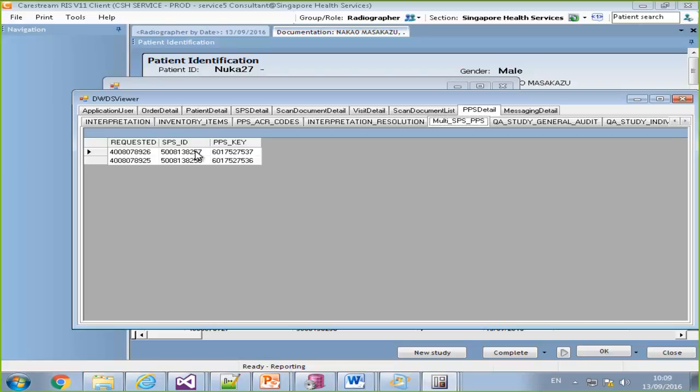I thought you could document together, you just have that particular field would not be copied. If you want to keep copies, you can, but then you won't enter the two fields individually. One procedure would have a certain radiation dose, and the other procedure would have a different radiation dose. But on the data window, you have one control, right? Unless you have a grid or something like that. Yeah, if you have a grid, you can. And then the grid would be skip copy.